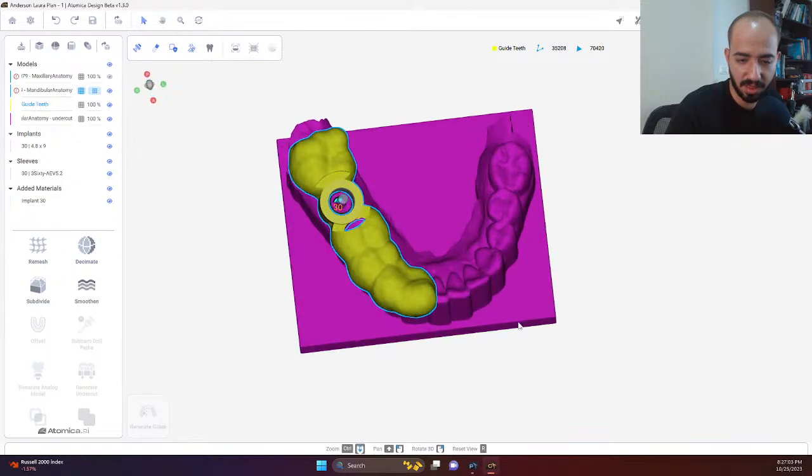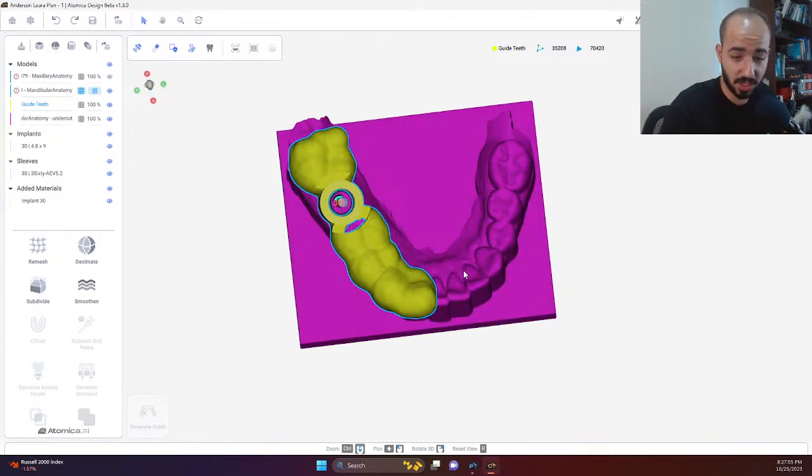And there are other things that will assist you if you wanted to personalize the guide a little bit more. There's the stamping option right here. If you wanted to, for example, use the name of your clinic or the name of your lab. I'm using the name of my company, of course. By unticking that, it will be embossed out.